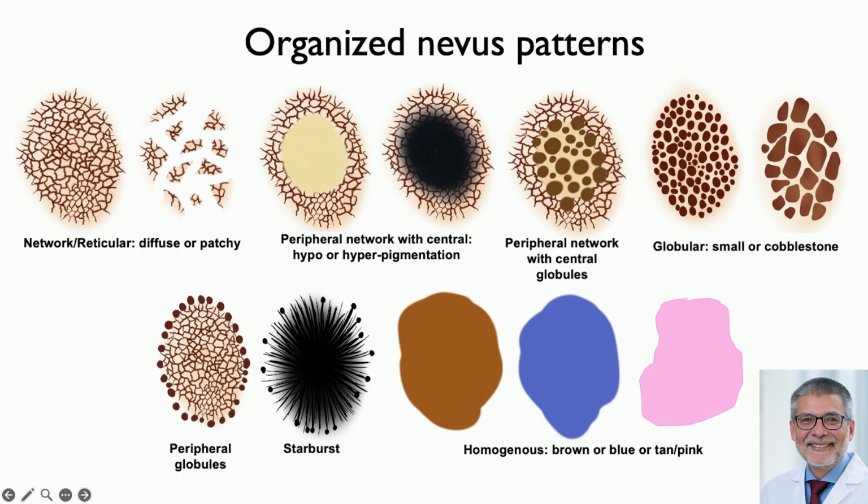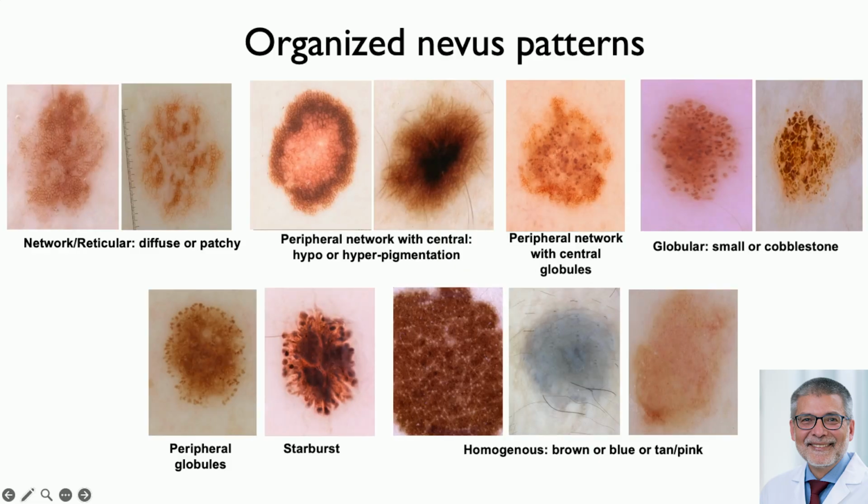There are a group of organized patterns that have been described for nevi. Those are the ones that I will highlight. But I'm going to also share with you that there are a couple of caveats for each one of these that require you to think a little bit deeper. On a very cursory look, we know that these are all benign patterns, but they always have to be in the right context. That's what I'm going to highlight here.